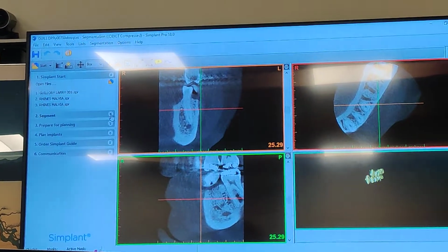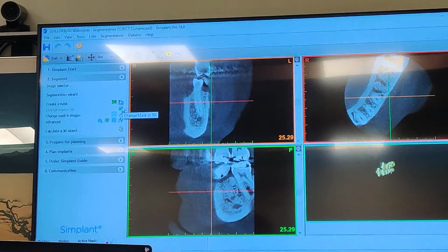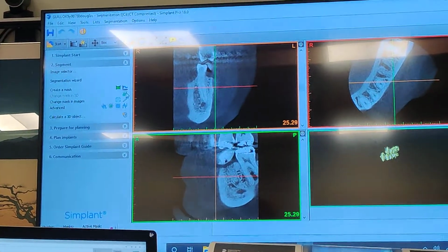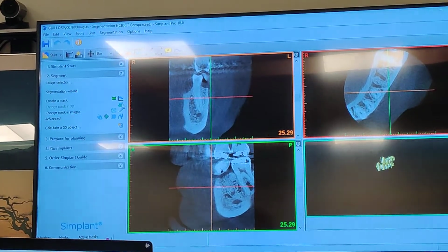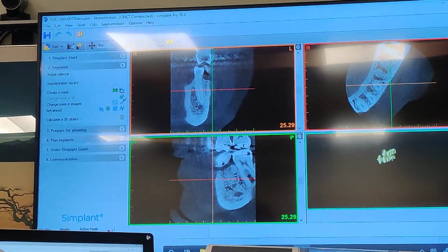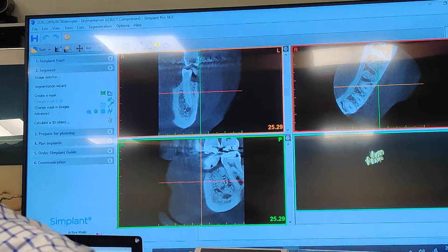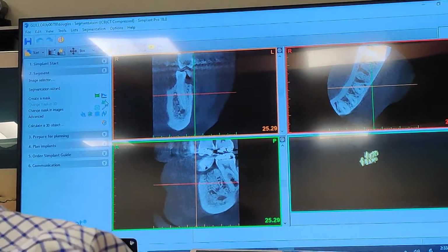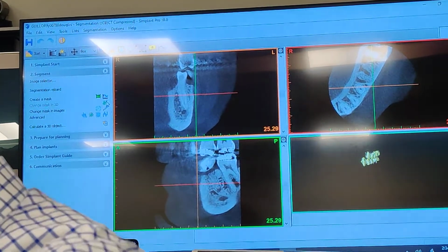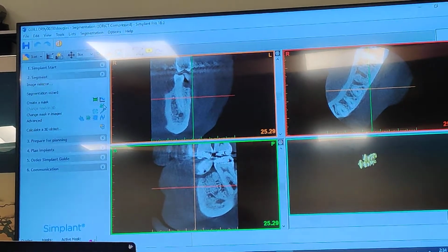So, now, segment. You can segment, residents. Y'all are little geeks, little millennial geeks. Or generation whatever, Z, X. Okay? Little generation Zers. So y'all may want to sit there and segment, which means you draw around each tooth and you're saying this is 18, this is 20. Okay, because then you can take 18 out and put 18 back, and put 20 there and take it. It's new, I mean, you don't need it.